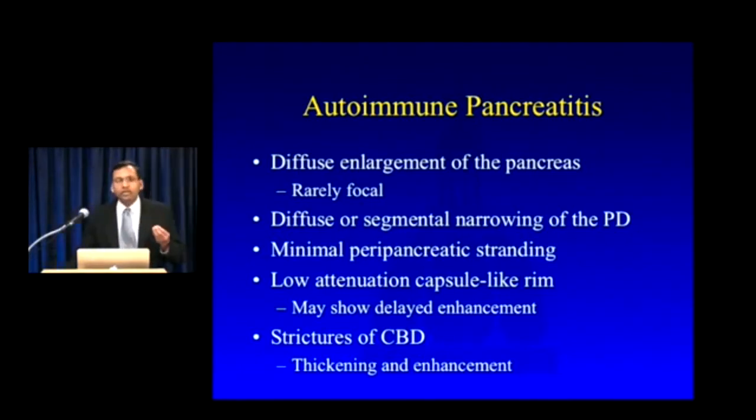Now, if you're lucky, you're going to see this low attenuation capsule or rim around the margins of the pancreas, and that capsule, or halo, as some people call it, will actually show delayed enhancement if you acquire multiphase imaging.